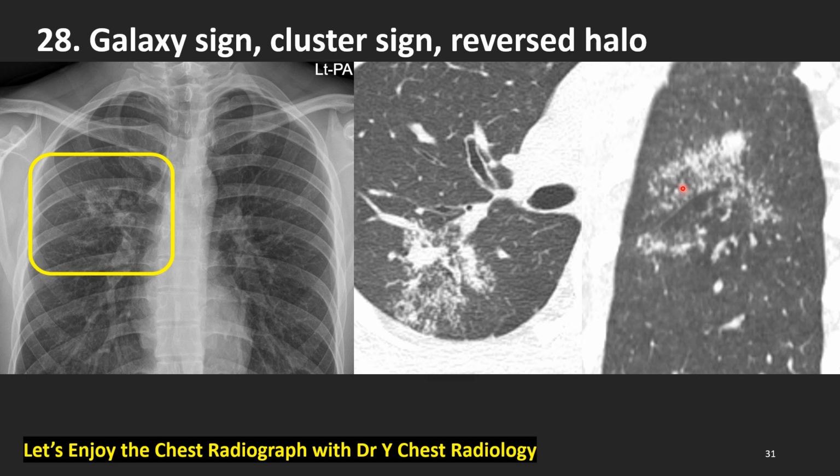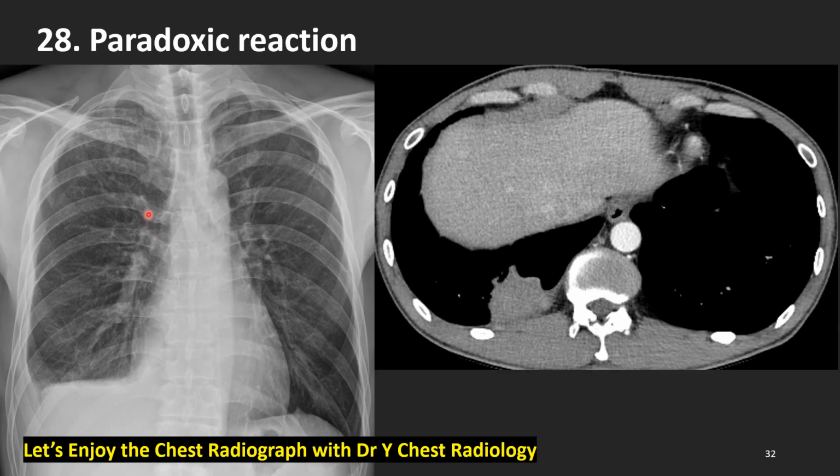In tuberculosis, it is different with sarcoidosis. As I said before, sarcoidosis are all granulomatous nodules, but in tuberculosis, it can be caseation granulomas or tree-in-bud patterns mixed. What do we see with this patient? Yes, right upper lobe tuberculous lesion, active mottled tree-in-bud pattern nodules here, active TB lesion with a moderate amount of pleural effusion, diffuse homogeneous density here of pleural effusion.